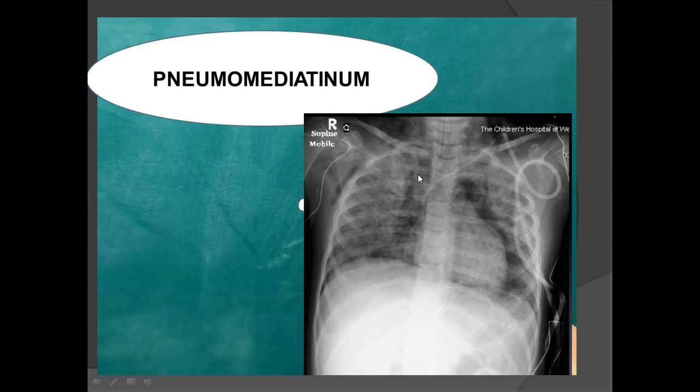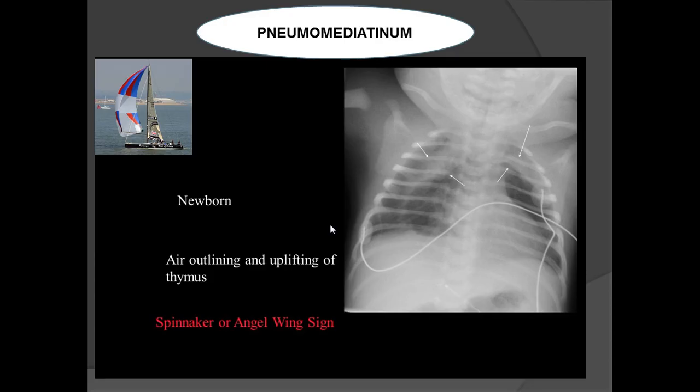Now coming to the pneumomediastinum, here the air is seen within the mediastinum. These streaky air lucencies are seen within the mediastinum on both sides, and also trickling along the pericardium, within the neck region, the axilla, all the way around. So this is the pneumomediastinum.